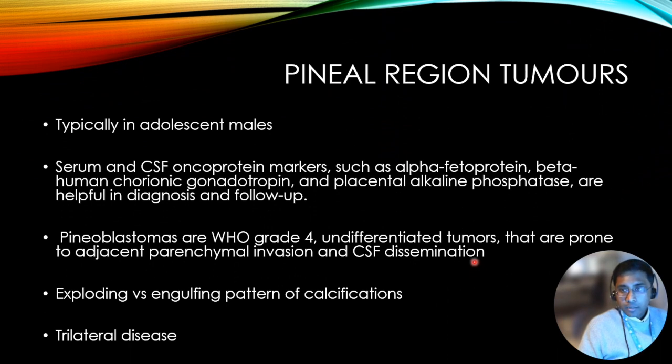In the pineal region tumors, remember they are typically in a slightly older child. We have some certain serum markers such as alpha fetoprotein which helps us diagnose germ cell tumors here. Blastomas are WHO grade 4 undifferentiated tumors, and it's very important that we screen the spine in such patients to look for CSF dissemination.